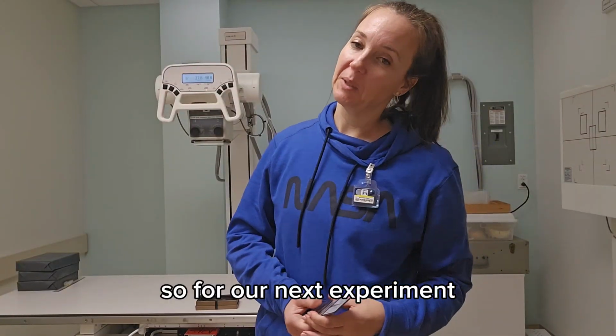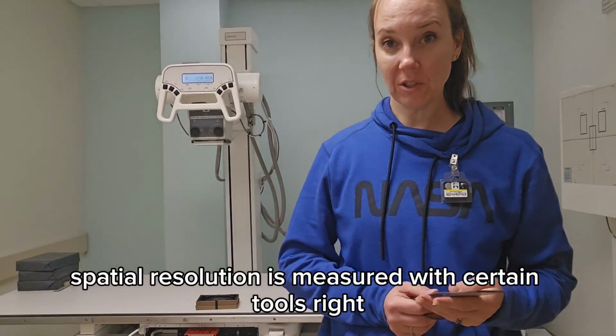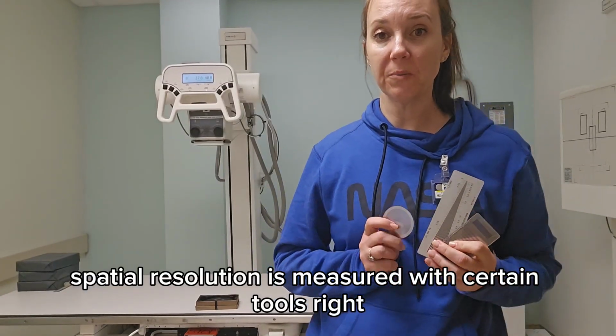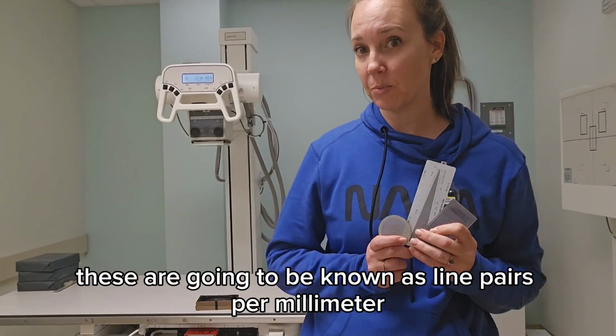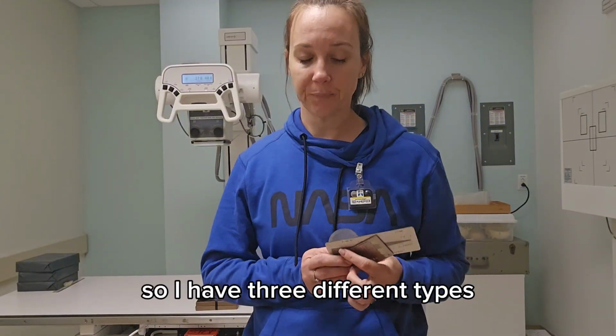So for our next experiment, what we're going to do is measure spatial resolution. Spatial resolution is measured with certain tools, right? These are known as line pairs per millimeter spatial resolution test tools. So I have 3 different types.